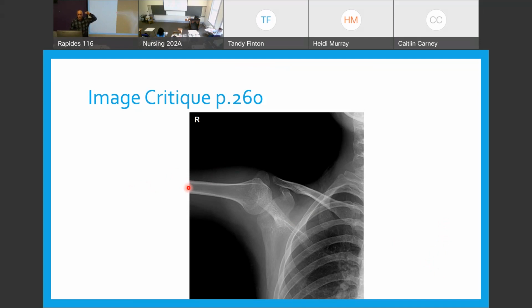I'm kind of going towards a scapula. Scapula. No. What do we see here? Half a chest. Look at the whole picture. Don't just look at the arm. So this is it. Here's the coracoid. Crosshair it.